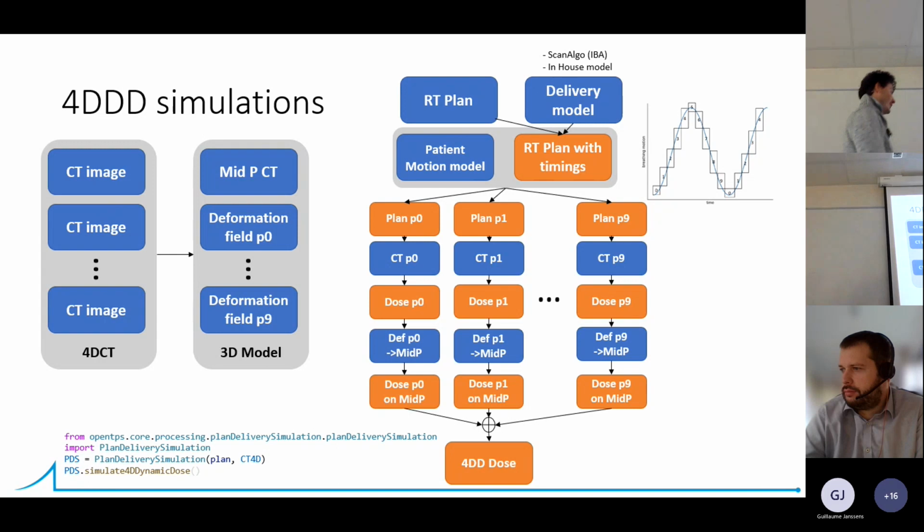And you can also do it quite easily in the same way as before in the code. It's another function, but of course you can also provide some more parameters, so the breathing period and things like that, that you can play with.